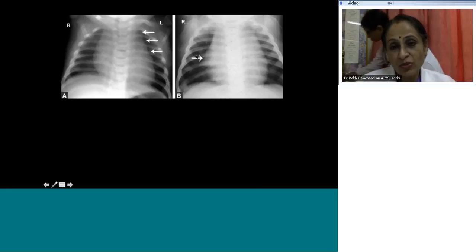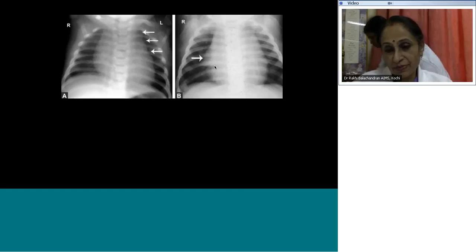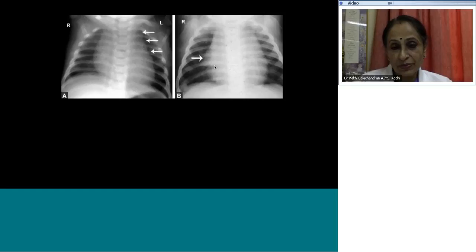Okay, what do you see here in this? And what do you see here? Any diagnosis? There is no cardiomegaly. The cardia appears normal. You had given the diagnosis earlier, and then I said it is wrong. Yeah, that is the thymus. Okay. The thymus is right.